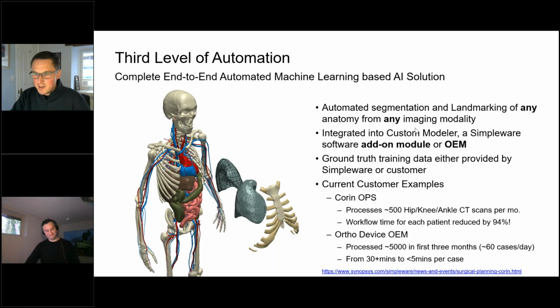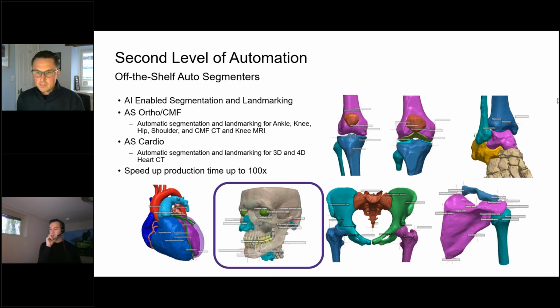Next question, does the hip CT include the SI joint for realistic joint spaces? Yeah, the hip CT in the AS Ortho tool does split the pelvis and sacrum, like you can see here. If there's a gap, it will preserve the gap. Again, the best thing to do is try it yourself and see how it works. But yeah, it should preserve gaps.